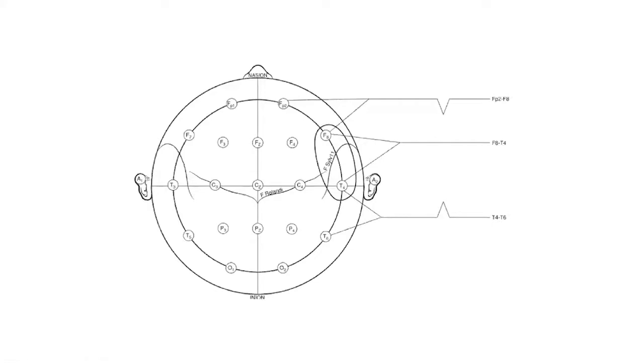It has to do with the amplitude present on the scalp. And that's an important lesson here because sometimes people get misled by amplitude. Amplitude has to do with the change in electrical field across the scalp. And you can have a very high amplitude at F8 and T4. Electrical fields can be very high at these 2 locations. But if they're the same, then the output in the EEG is flat. And so that can mislead you to think that it's nothing there when in fact there is.